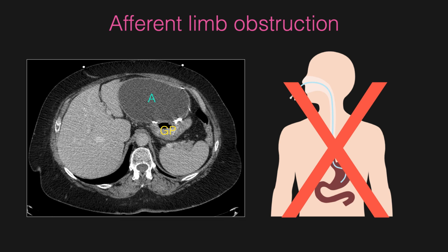So I like to make this very clear when I'm reporting. It is worth a phone call to directly tell the team that the patient has bypass anatomy and that the NG tube will not address the problem in this case. In your impression, it's often helpful to describe the afferent and roux limbs separately, or even use simpler terminology like excluded stomach / hepatobiliary limb or alimentary limb for the roux limb so everyone is on the same page and comfortable with what is happening.